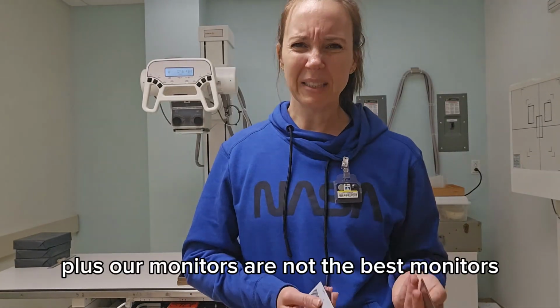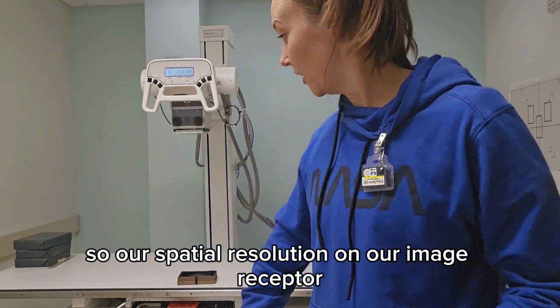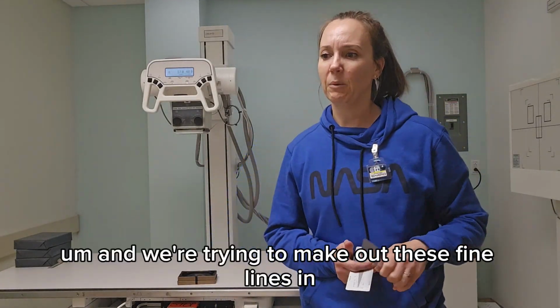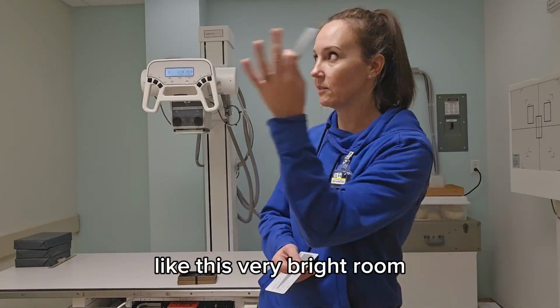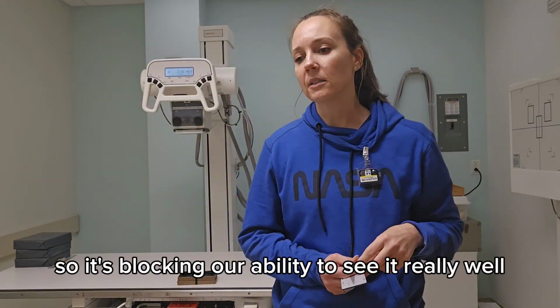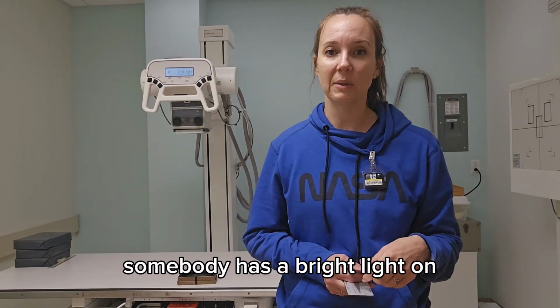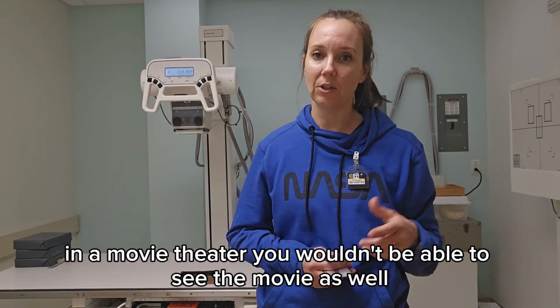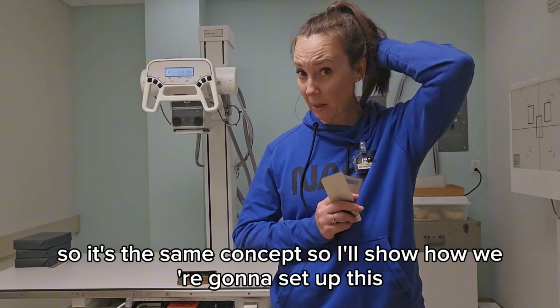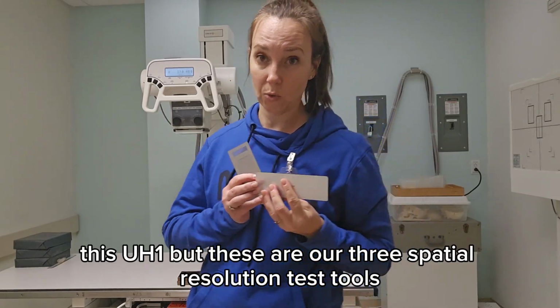Plus our monitors are not the best monitors, so the spatial resolution on our image receptor could be better than what it actually is on the monitor. And we're trying to make out these fine lines in a very bright room, which is, remember, a lot of extra light known as noise. So it's blocking our ability to see it really well, just like if somebody has a bright light on in a movie theater, you wouldn't be able to see the movie as well. So it's the same concept. I'll show how we're going to set up this one, but these are our 3 spatial resolution test tools.